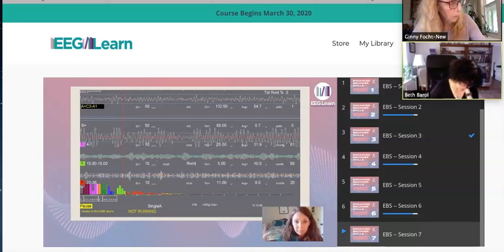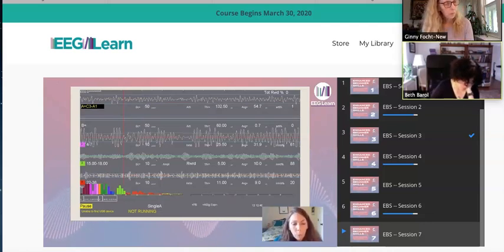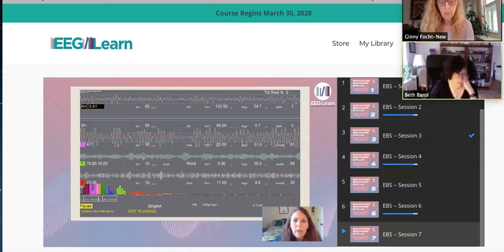That's going to show up again when we look at the filter band. So again, we're inhibiting 4 to 7. In this example, we're rewarding 15 to 18 and inhibiting 22 to 36. When I look at the average amplitudes, it is true that all the average amplitudes are higher than we might want them to be. But by far, the slow wave is the farthest off from what we would want it to be.